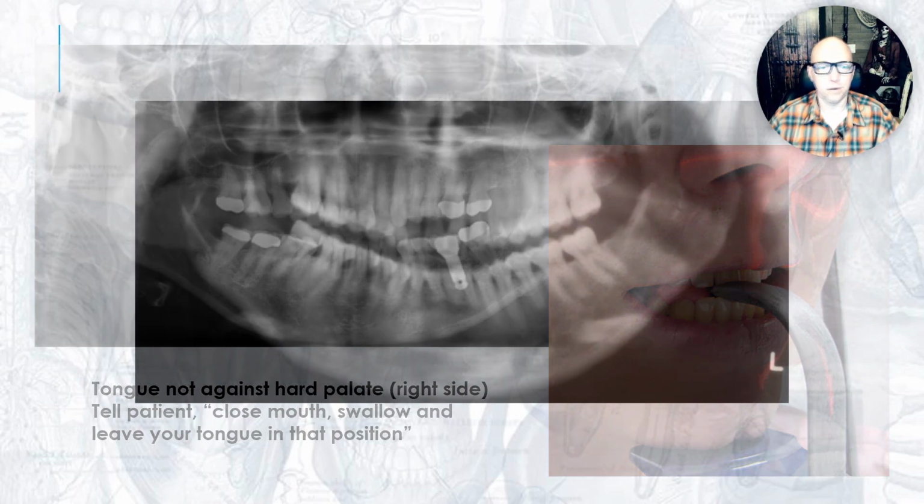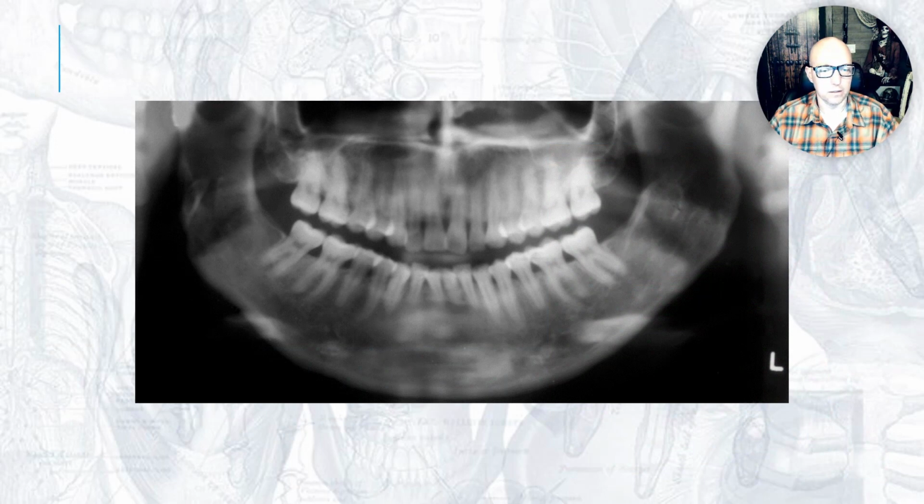All right, here's the Joker smile. This is what I mean by the Joker. Way too much chin down. Make your patients happy, but not that happy, right? You cut the TMJs off just from the sheer amount of chin downness that was there. Well, what happens to the hyoid bone when that happens? The hyoid bone then gets projected over the inferior portion of the mandible.